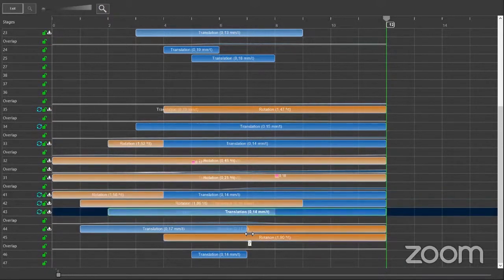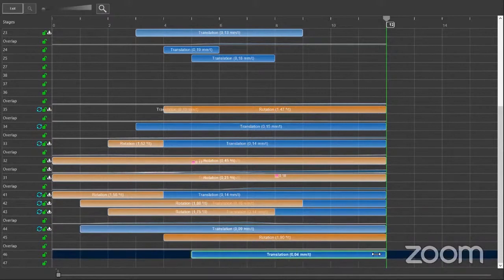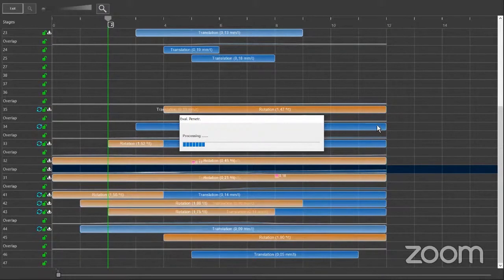If we want to see the exact type of movement, we can also do that. But let me just see how our summary changes after doing this differently. And then we're going to add attachments where we need to add attachments and look at our final treatment on our simulation and the movements. And the movements will barely be noticeable, at least on the lower model, because I've extended them until the last movement.